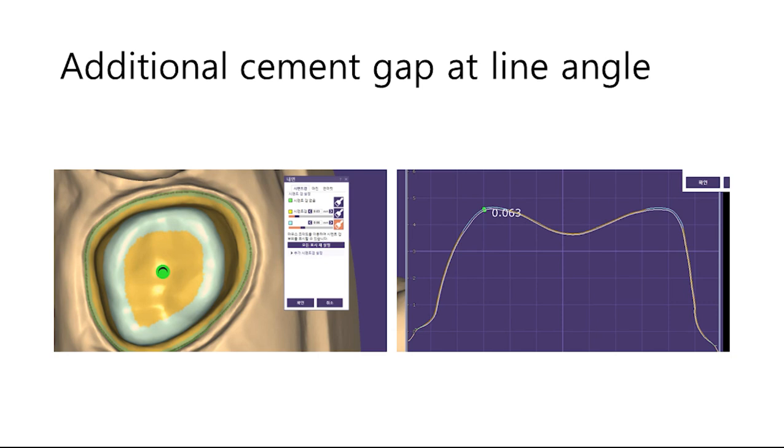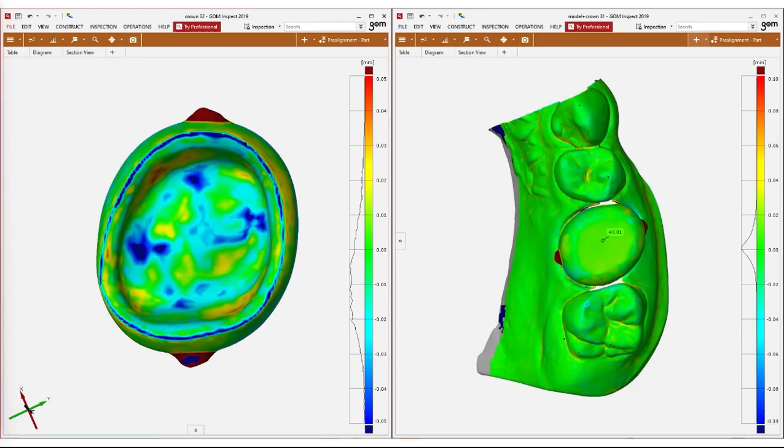I'd also like to add that you shouldn't only look at the data from the equipment company, but check it yourself before buying it. We'll talk more about this next time. These photos validate the machining results.